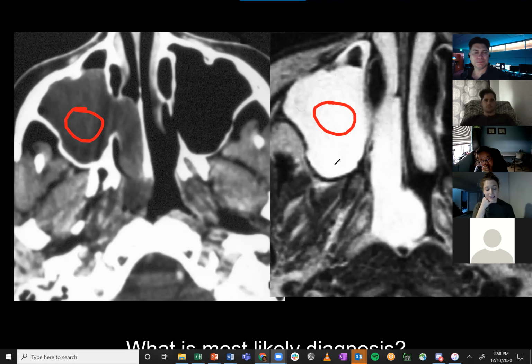Well, it is light bulb bright on T2. So it would be potentially fluid or myxoid. Is this density good for fluid? Yes, it is. Awesome for fluid. What if this was just a little cyst in the maxillary sinus? It wasn't going out in the nasal vault. Then what would you call it? Just a mucus retention cyst.